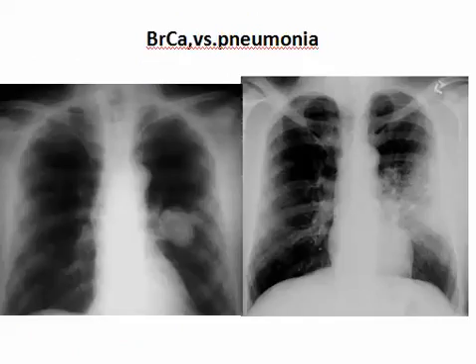As we said, this is an example of how to mix bronchogenic carcinoma with pneumonia. Here is the central mass, which is related to the dense left hilum, and it has distal atelectasis, while this one is a large opacity which is seen pointing to the hilum. It is following lobar distribution, likely to be pneumonia, but don't forget that such an appearance, if persisted more than 2 weeks, is due to central bronchogenic carcinoma as well.